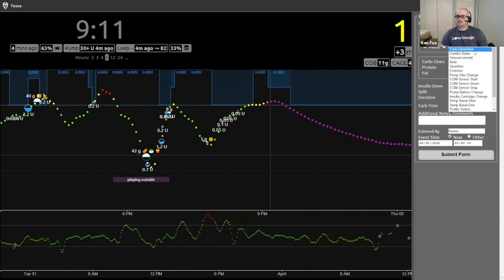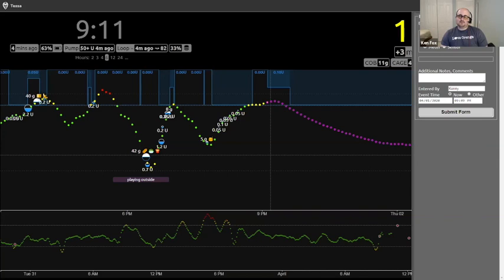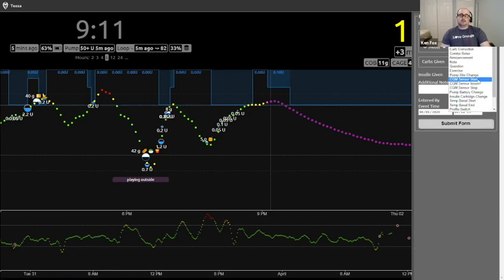Yeah, that's fun. Snack bolus, meal bolus, exercise, questions. I guess maybe announcements and questions can be used for communicating to other people. My wife and I used Nightscout well before we used Loop as a way to communicate what was done, largely tracking insulin given before we had something like Loop to track insulin on board and all of that. So this is a good way to keep track of someone else, as well as coming in here looking at your own information.